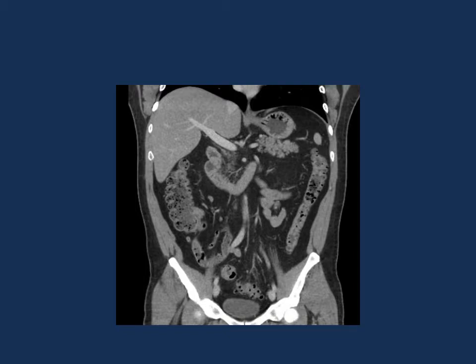All right, so now this is the coronal view of the same patient or same basically anatomic region. And now you can see the ascending colon and the cecum much more clearly. Well, actually, we're starting out with the duodenum. Sorry about that. Yeah, you can see the C shape of the duodenum, as you guys all sort of know.